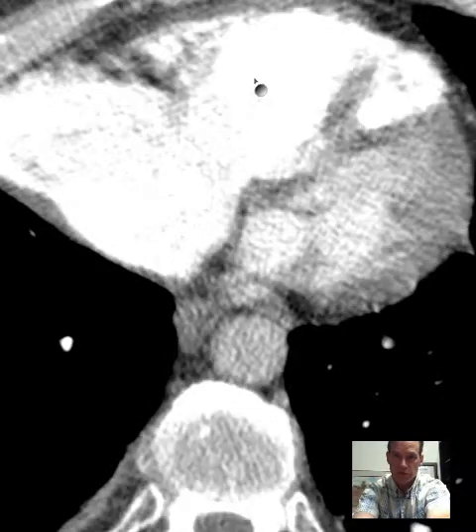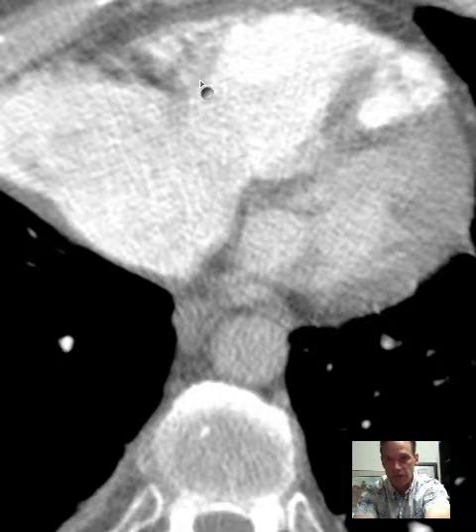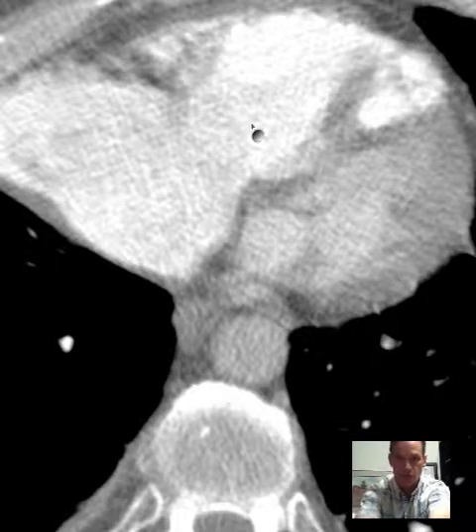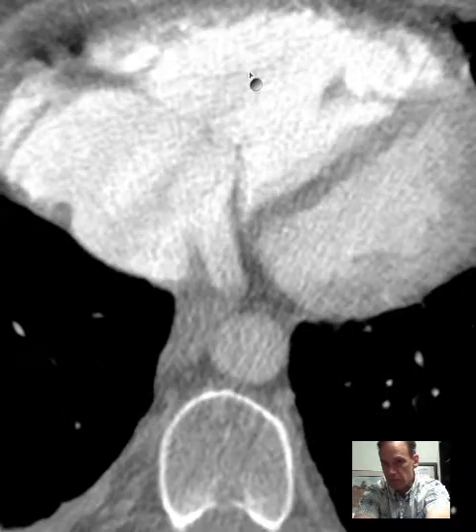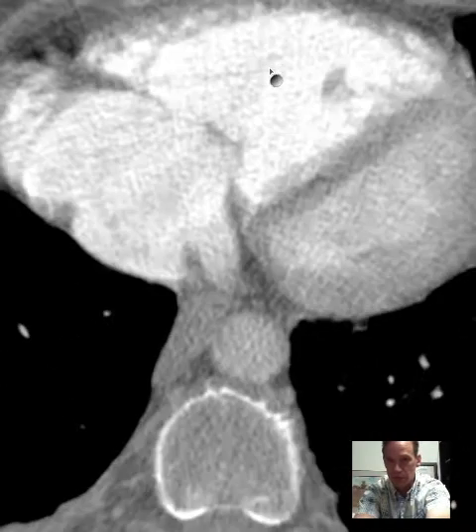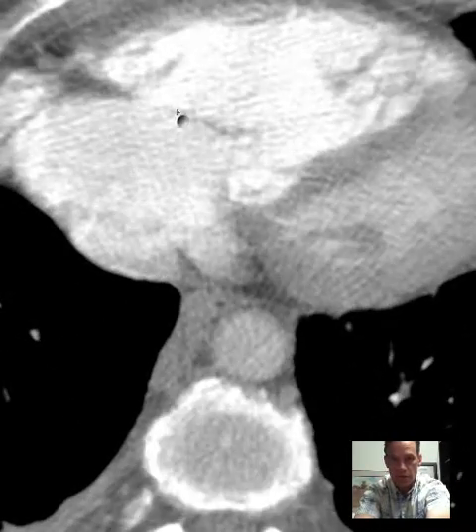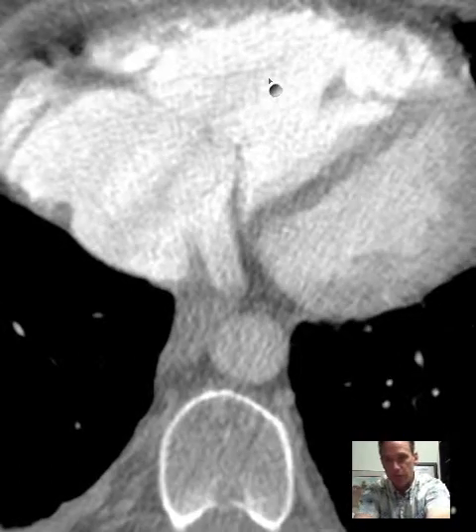the right ventricle. Right atrium, right ventricle, and sometimes if you window this, you might see little hints of a valve there. This may be a valve leaflet here that's open. This is a chorda tendineae, or maybe small papillary muscle. There's part of the valve complex right there. Anyway, this is right atrium, right ventricle.